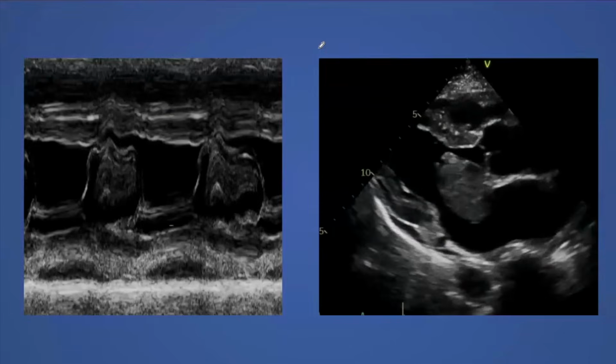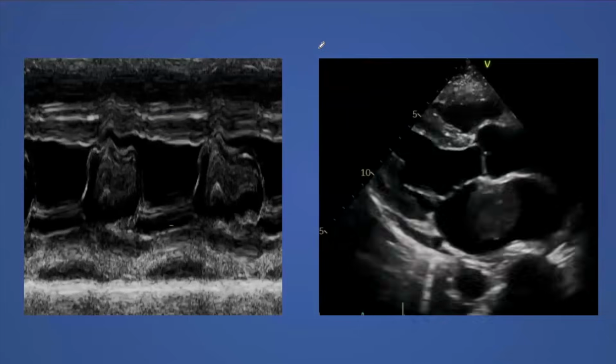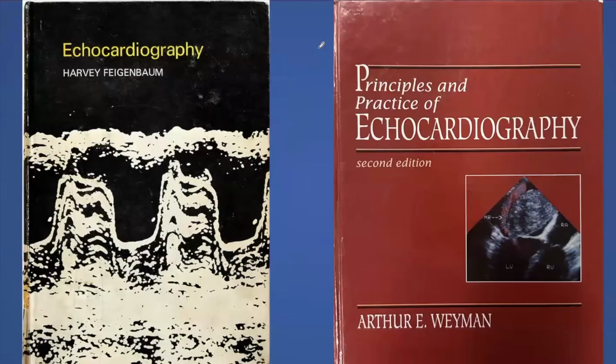This was here in St. Mark's, by the way. And this patient came for another reason. He has a mass in the tricuspid valve and something like PE, and then we found this one. And why did I bring this one? What's the diagnosis between those two books?